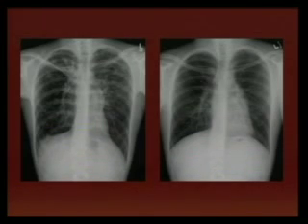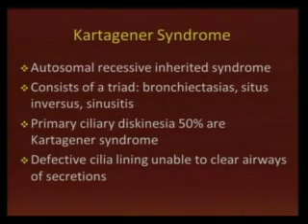And here we have the same patient after transplantation. So this could be the solution, but unfortunately this patient, 2 years after this film, had a new episode of cystic bronchiectasis, and you can see in the new study multiple bronchiectasis involving both lungs. So this is not a definite solution, but could be one of the possible treatments in this disease.